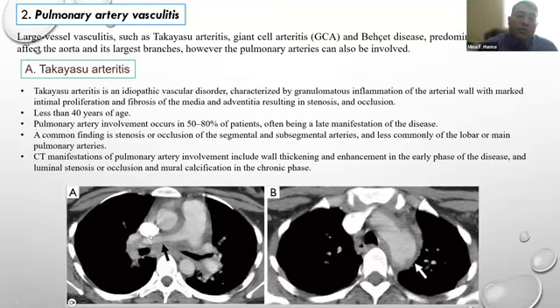When you go to the pulmonary artery, instead of seeing a normal pulmonary artery, you will find a diminished lumen and thickened wall around it. Again, if you do an FDG, there may be FDG uptake around the artery, not something inside the arterial lumen.